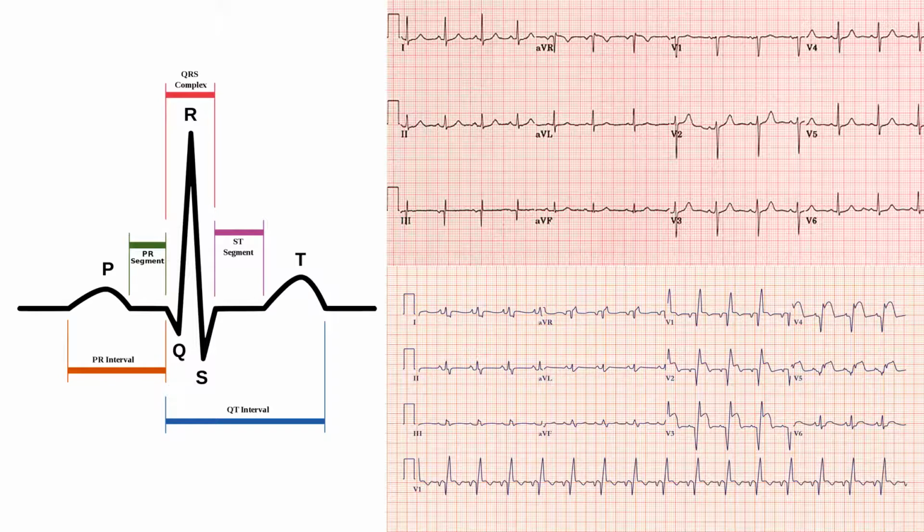It means that this segment should be straight. Or in other words, it should not be positive like the P wave, or negative like the Q wave.